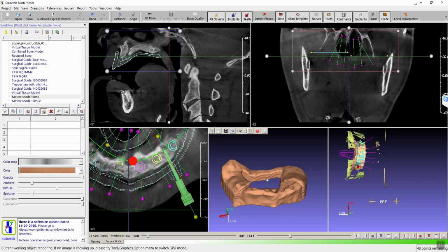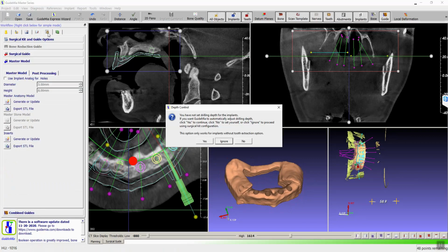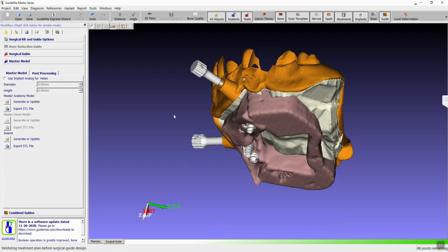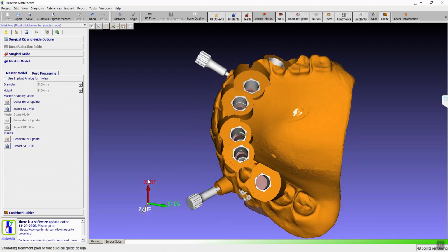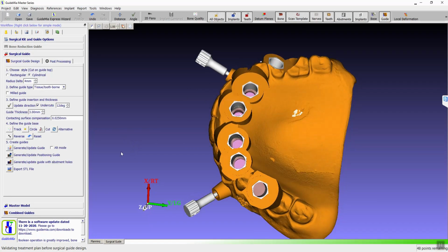Now go back. Can you go back to where we could put the anchor holes in the model, the abutment holes? You want to generate that? Again, stacking thing upon thing. Yes, abutment holes. Generate that. Let's see how much memory your computer has.